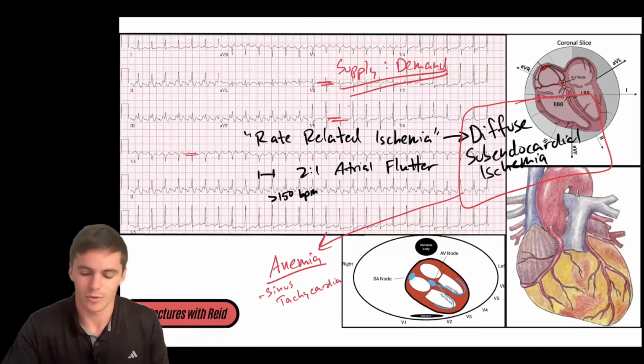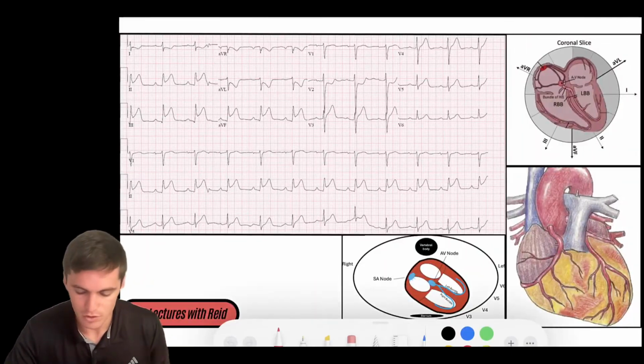Let's jump into the fun stuff. So first EKG here, we're not going to go through the full approach for all these EKGs. We've got a bunch.